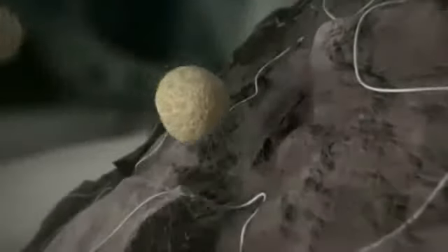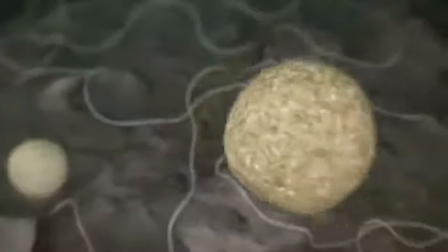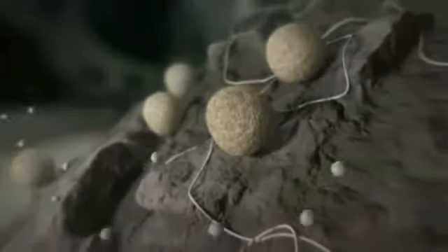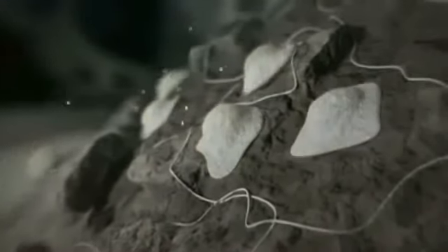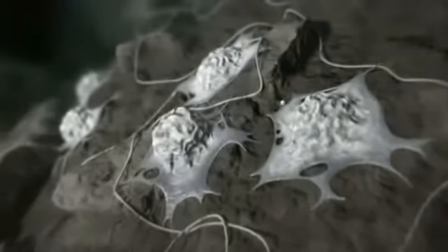Perivascular cells not only create new blood vessels, they also migrate toward existing trabeculae and to the implant surface, where they differentiate into new osteoblasts under the influence of BMPs from the dissolved bone. The adsorbed proteins such as fibronectin have a crucial influence on the attachment of bone progenitor cells to the implant surface.